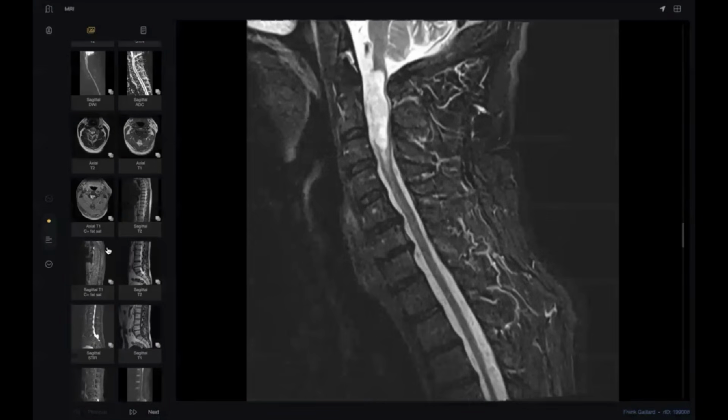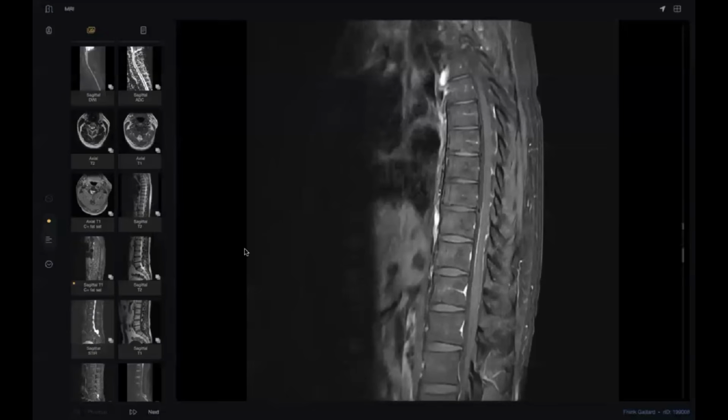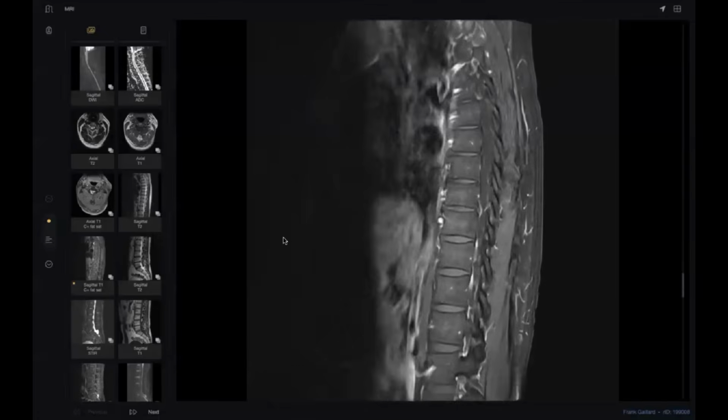So, your next examination, you told me, Dr. Nam, I will do brain. Do you think the CSF will go up or down? Down. So the most common drop metastasis will be down. So we must examine the whole spine. Here, this is the dorsolumbar. I think nothing obvious.